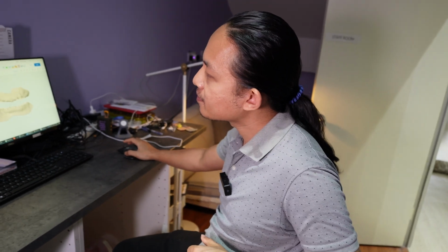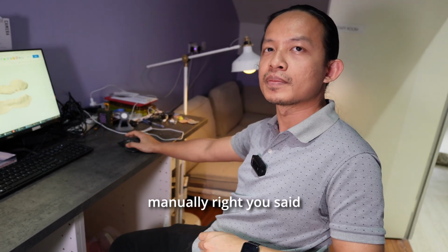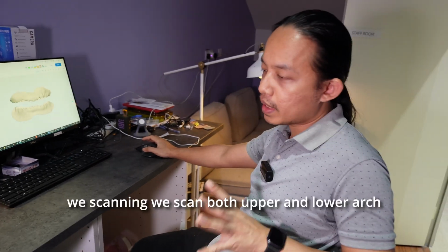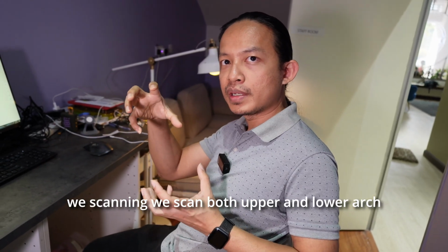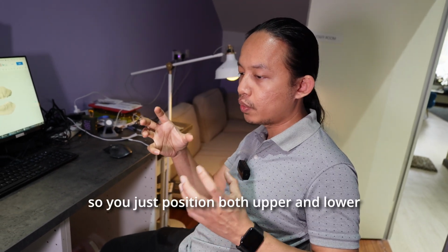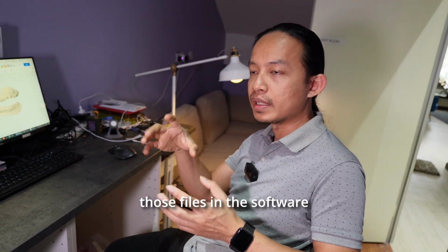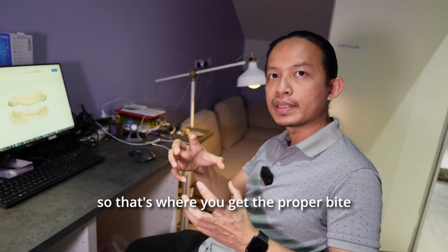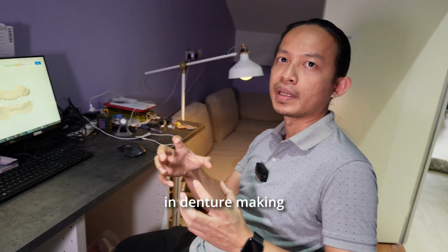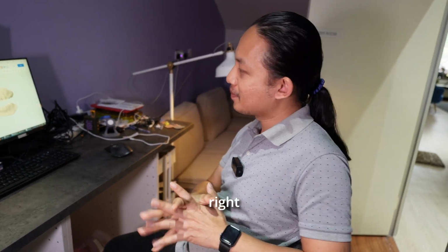And let's say we take an MMR manually, right? Then how do we transfer the bite to here? It's just positioning. With scanning, we scan both upper and lower arch. With the MMR, you have the bite registration in wax. So you just position both upper and lower and you scan them together. Then you correlate those files in the software. That's where you get the proper bite, because that is quite important. MMR is basically the most important part in denture making. If you mess that up, then your denture will be off as well, right?